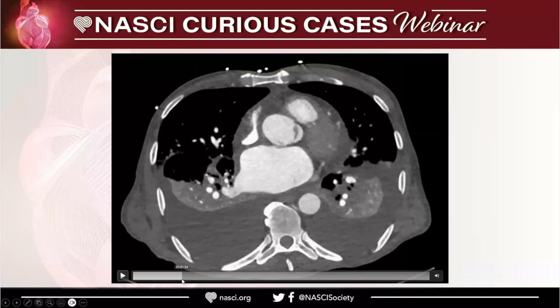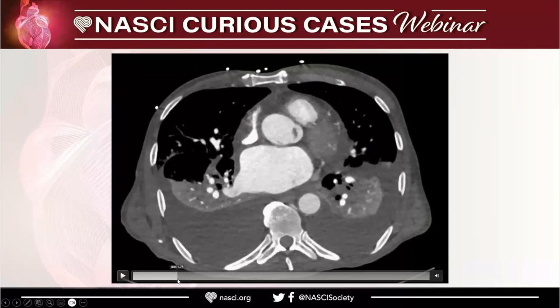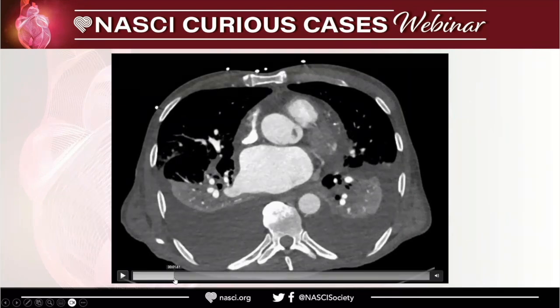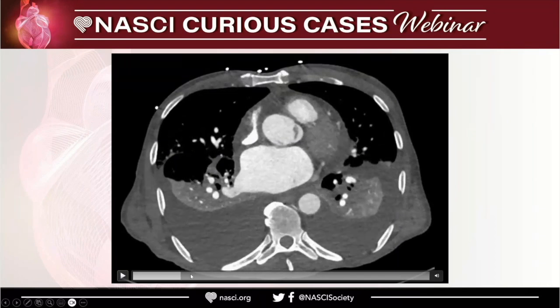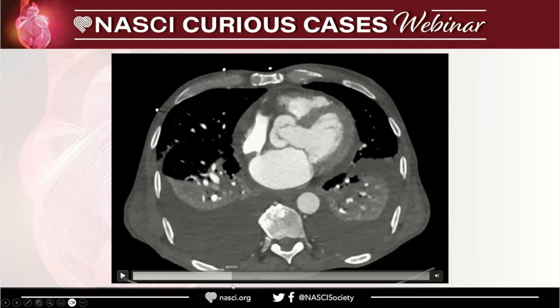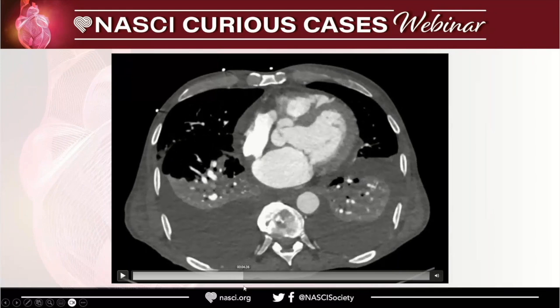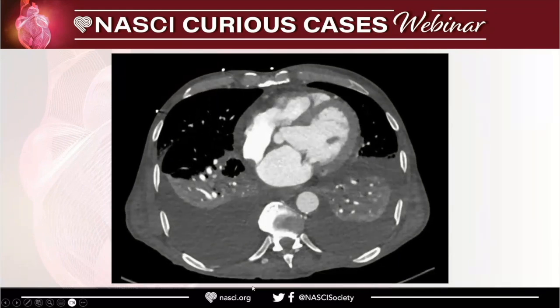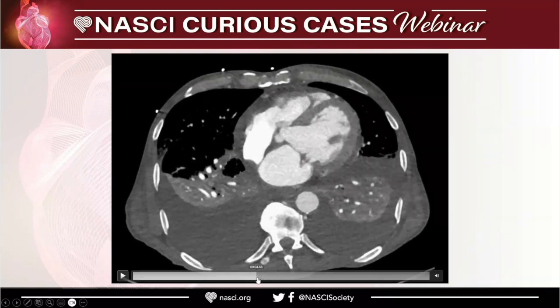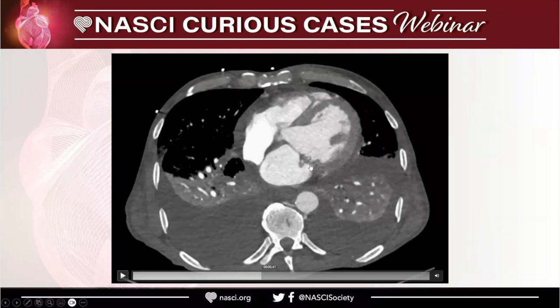You saw an abnormality here, as we are focusing on the cardiovascular chest. Yeah, the aortic valve leaflets are thick and lobulated. And then the mitral valve area. When we concentrate on the mitral valve area, it also doesn't look really good.